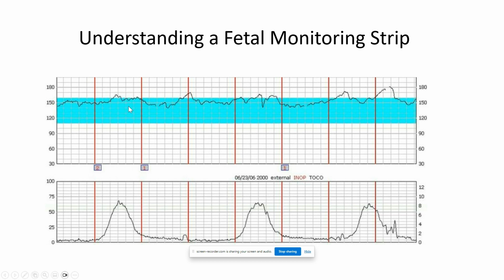No, it's not an acceleration because the baseline here at 150 only goes up a little bit and goes across. It's not a big enough acceleration to be considered an acceleration, if that makes sense. We do love that this has a lot of grooves, that it's going up and fluctuating, but an acceleration would be something like this, okay? Even something like this over here. Okay, so these are considered an acceleration.